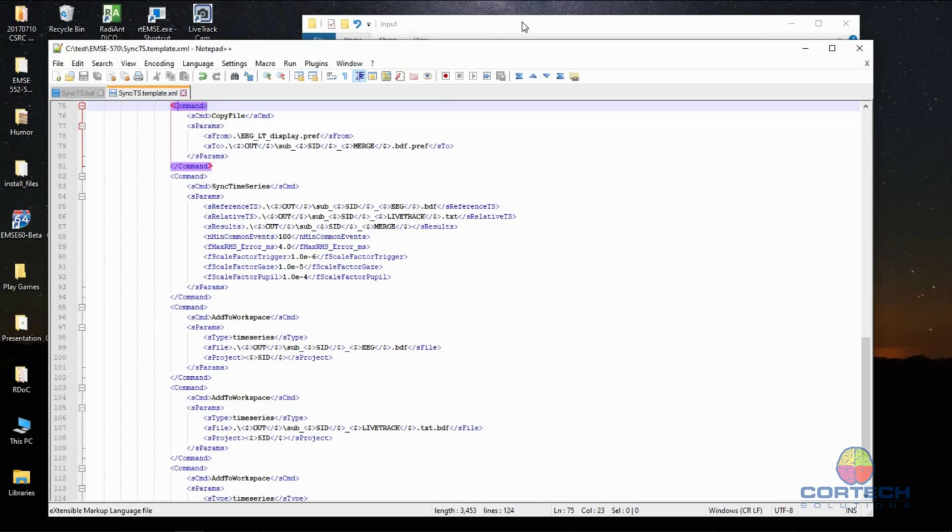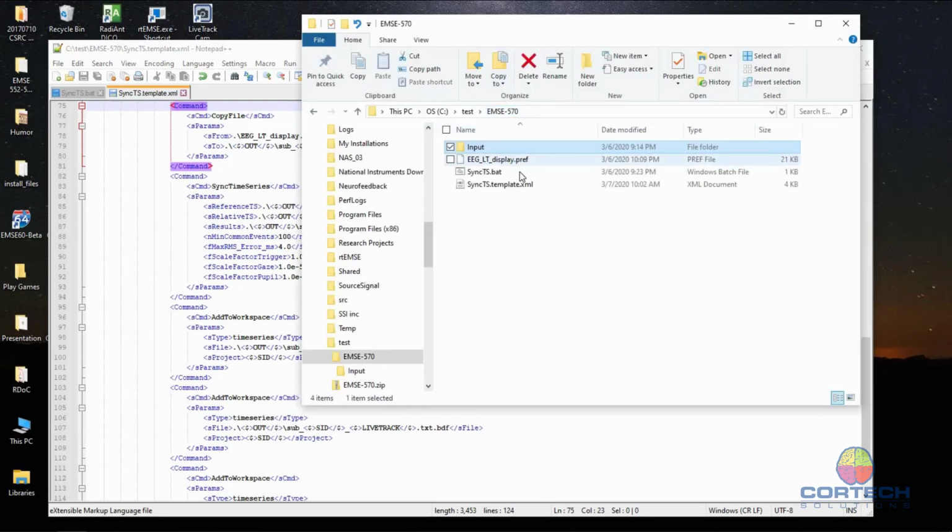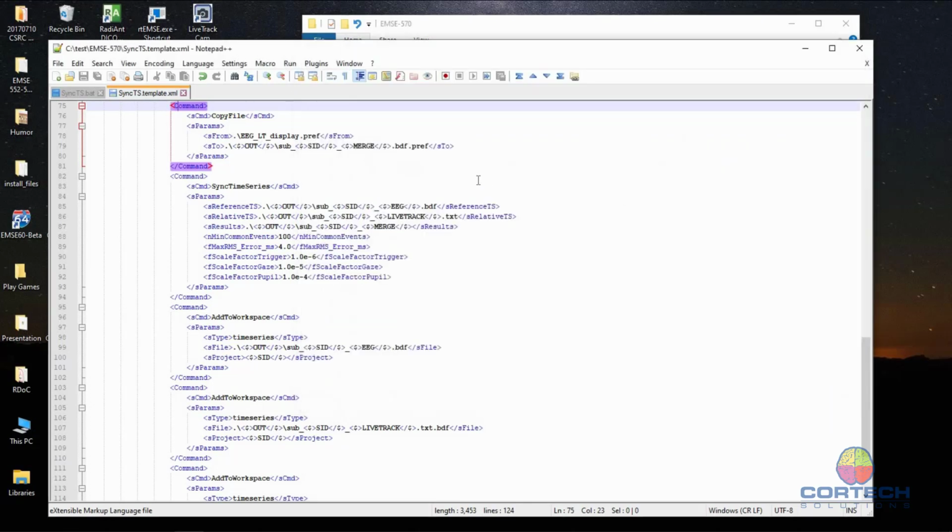These display preferences I'll just mention. We don't have to look at those, but these display preferences here will do things like give different channels different colors so we can look at them differently, as you'll see. It's more for the convenience of display, and you don't have to use it in your application. But here's the main command.